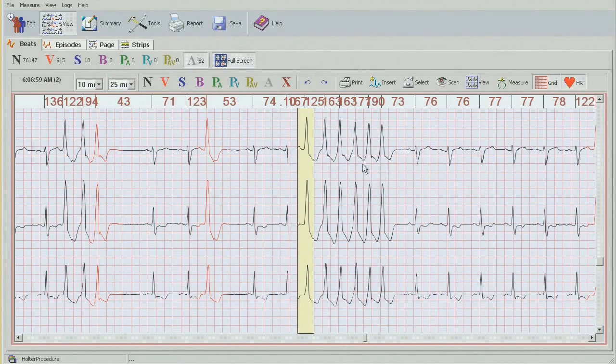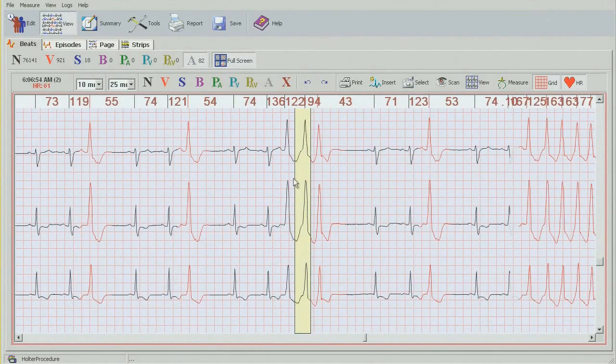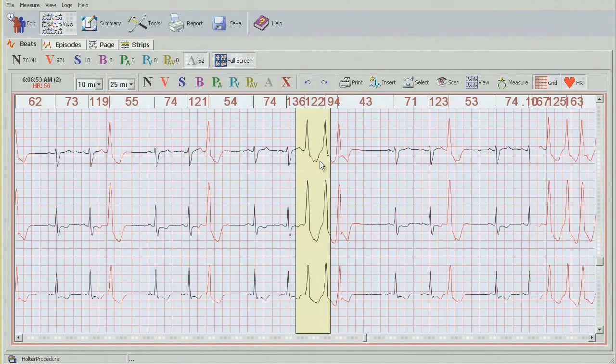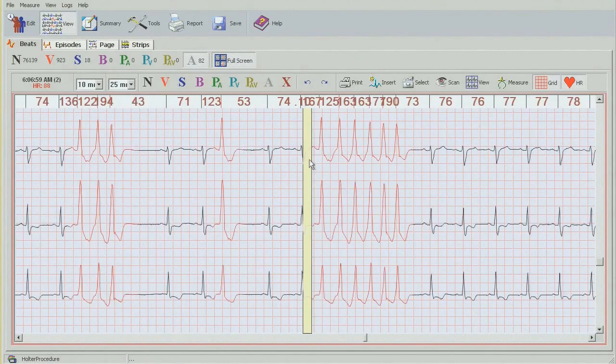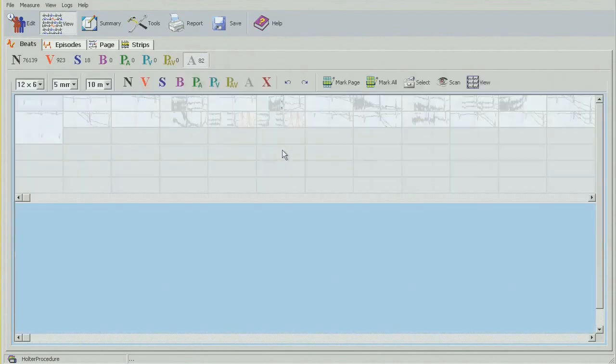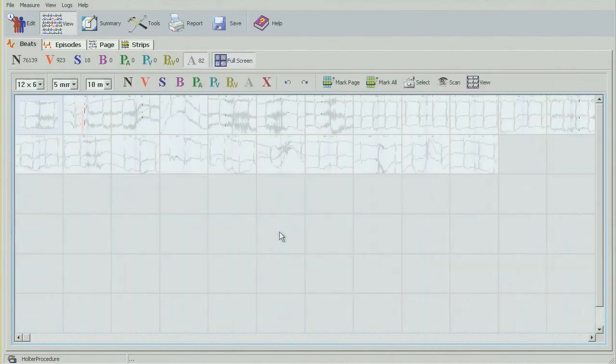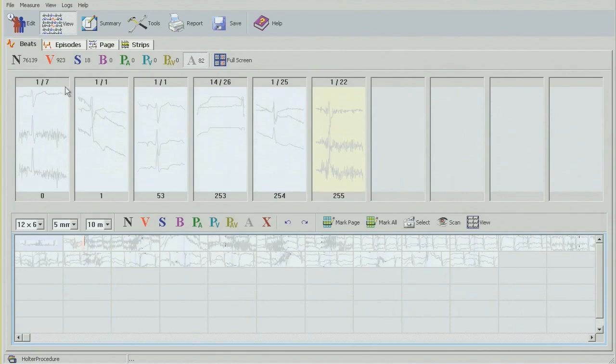So I'm going to change all of them again, shift down key, click on the last one, change to ventricular. This one here, while I'm on this page, I can change these two as well to ventricular, and go back to where I was. And everything else seems to be fine. So Z button to go out of there, couple of bins left, and the last one. And these are fine. So we're pretty much done editing through all the beats.